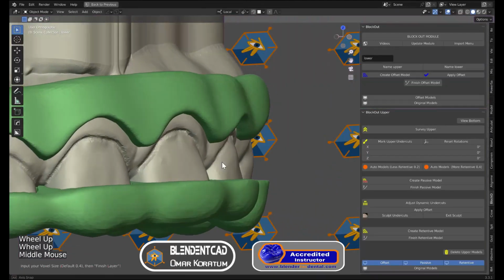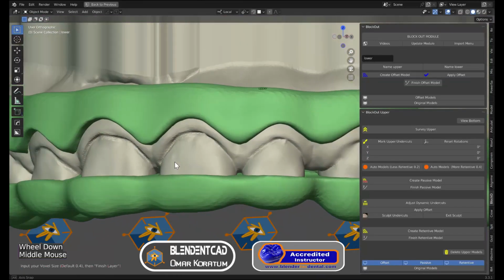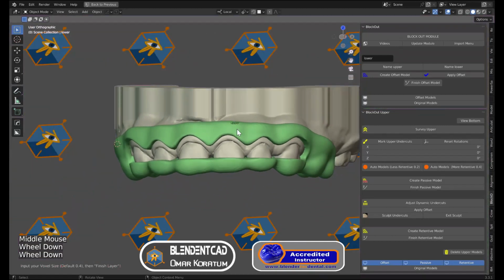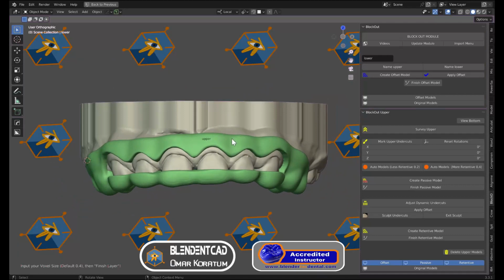And here is the soft crown lengthening guide, which allows us to cut 2 millimeters from the gingival margin. So here is my way of designing soft crown lengthening guide. I hope you liked this video, and thank you very much.